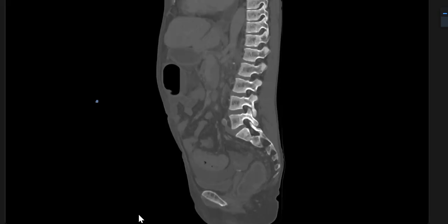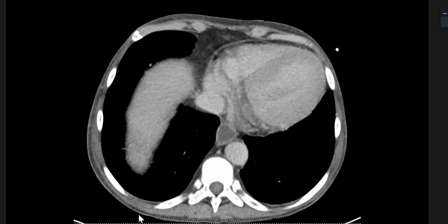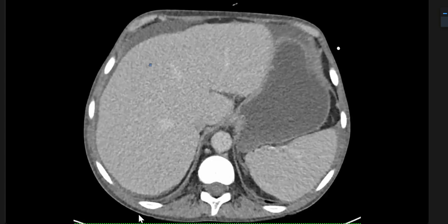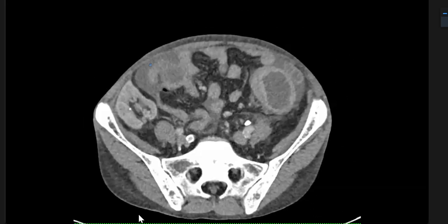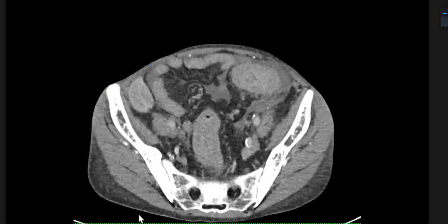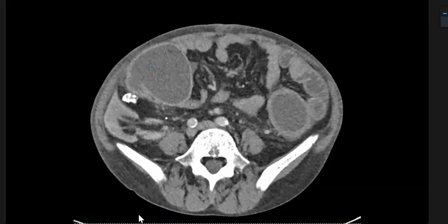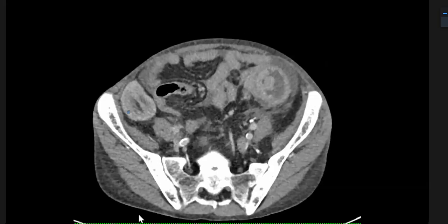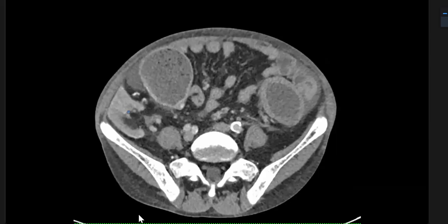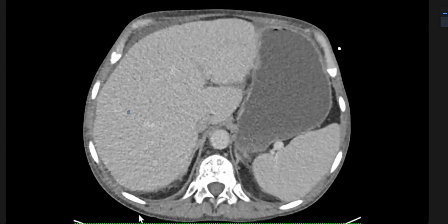So there are two things in this patient: one is an acute issue, one is a chronic issue. This is an ideal long case. It can be done as a long case, and it can come as a short case as well. It's a beautiful long case. Here, this patient has got colitis, intussusception, toxic megacolon, renal transplant, chronic kidney disease, and rugger jersey spine because of the chronic renal insufficiency, and also portal hypertension.